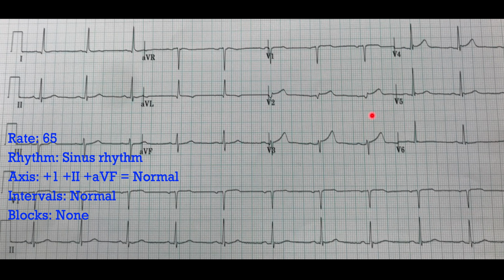So anteroseptal ST elevation, we don't see over on the lateral aspect, or especially in the inferior leads, we don't see a lot of ST depression or reciprocal changes that we might think about. But in this case, this is a little bit concerning, especially given this elevation in lead V2. So I'm going to say that there's some concerning ST elevation in leads V2 through V4.